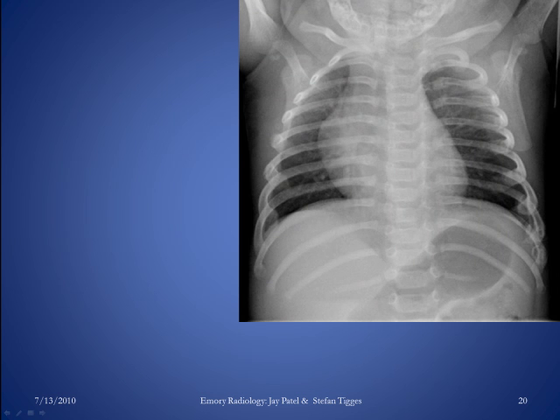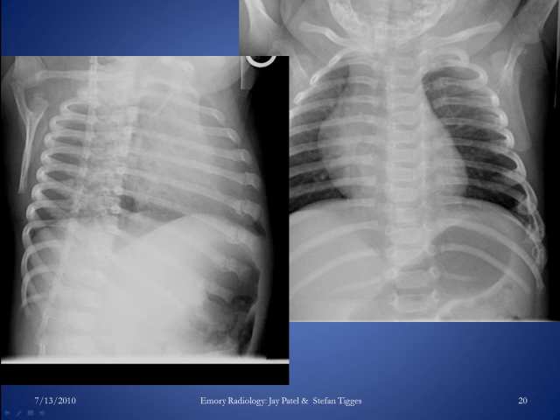On this frontal radiograph of the ribs, it may be difficult to see, but there are fractures. There are multiple right-sided rib fractures right here and right here. Typically, if you can't see fractures too well on a film, physicians will order oblique films, or radiologists will suggest getting oblique films to bring out fracture lines a little bit better. So on these oblique films, now we can see multiple fractures right here, here, here, here, and here, and here. And some of them have callus formation, so some of these are in healing phase.